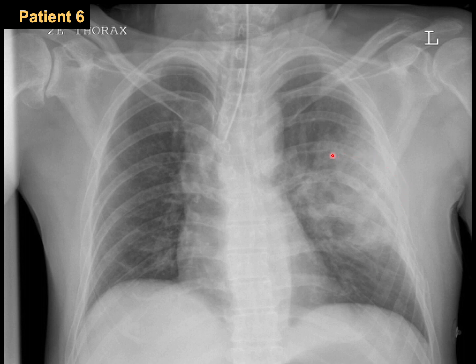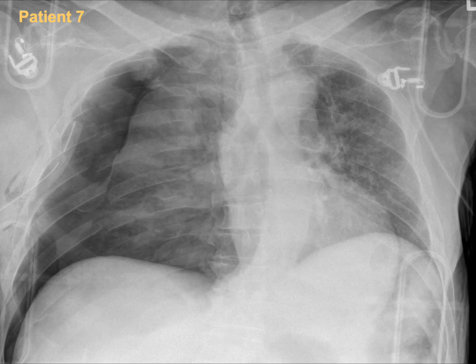If you find that these fractures are more than 2 ribs and more than one level in each rib, don't wait for the paradoxical movement to diagnose the flail chest, because sometimes the patient will not have this paradoxical movement in the early phases of the flail chest due to the muscle spasm. Maybe after a few hours you are going to have it, so you have to have a very high index of suspicion in diagnosing the flail chest. Okay, moving on.